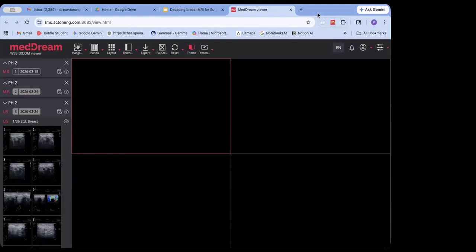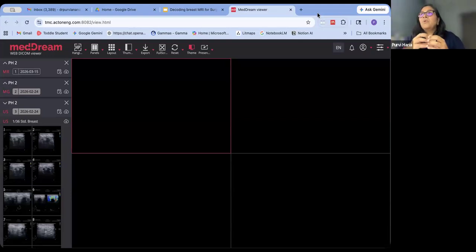Okay. And will ILC show diffusion restriction, or will it show limited diffusion restriction? So ILC depends, like some of these ILCs are predominantly architectural distortion, where we don't expect a very high diffusion. The ADC values will not drop to 0.8, 0.7. It will remain on a higher side, probably 1.1, 1.2, or 1.3. So it will not show significant restricted diffusion because it's not forming a mass or compact cells. The cells are diffusely scattered, so we won't see very high diffusion restriction.